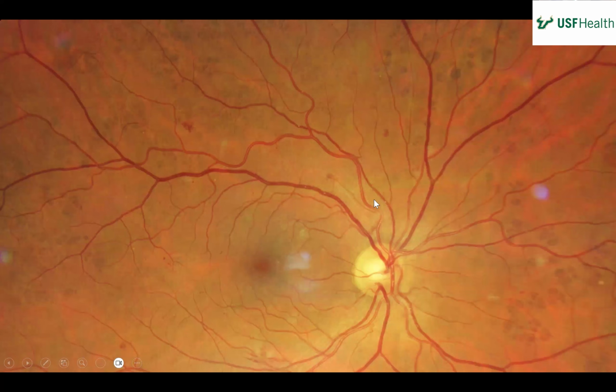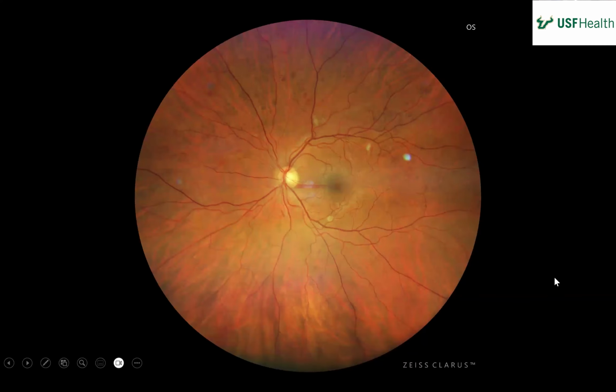You can zoom in a little bit so people can learn. In these eyes, there are dot blot hemorrhages and an area of hyperpigmentation, kind of scattered. Maybe mention the dot blots as well, and talk a little more about the pigmented lesions. Just beyond the arcades, they look to be maybe subretinal, within the choroid here, with a speckled appearance scattered throughout.